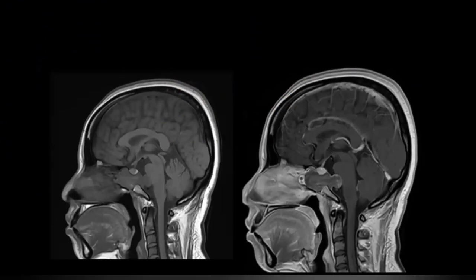If I tell you this lesion is coming from the clivus, the clivus has two parts, basisphenoid and basiocciput. So this is coming from the basisphenoid part. So what will be your differential? It could be a chordoma. On what basis? Is there any particular feature which suggests chordoma, or what will the other differential be?